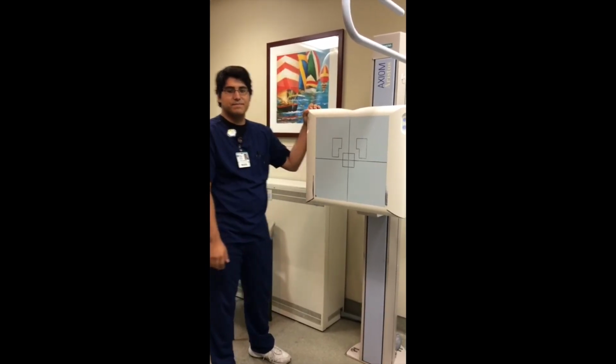Good luck, guys. To conclude, we now know what an AEC is. It is an automatic exposure control device used to consistently control the amount of radiation reaching the image receptor by terminating the length of exposure. We know that it was known as phototimers before, and now they are ionization chambers. We know that minimum response time is the length of time necessary for the AEC to respond to the ionization and send a signal to terminate the exposure.